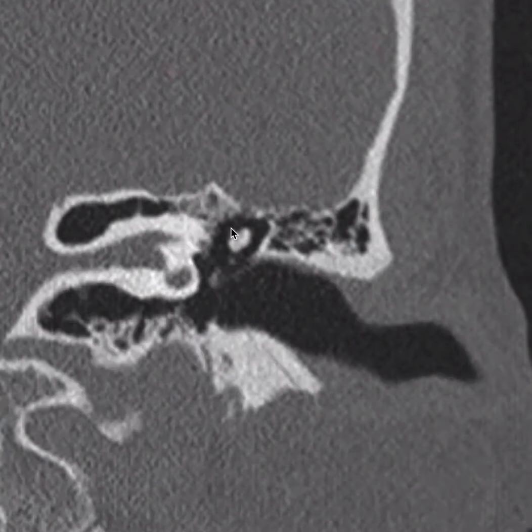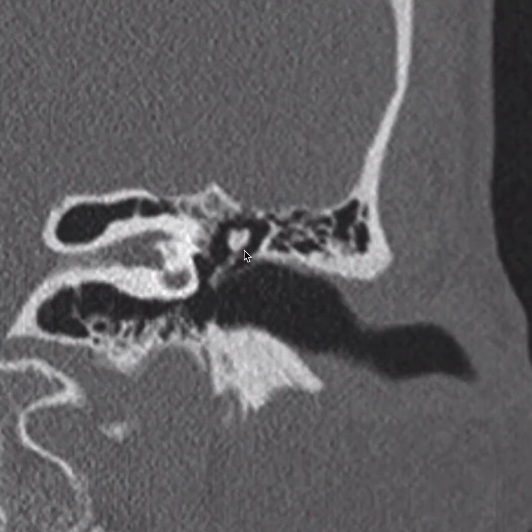Scrolling back posteriorly a little bit, we see an important ligament right here attaching to the neck of the malleus. This is the lateral mallear ligament. This forms the superior border of Prussak space.